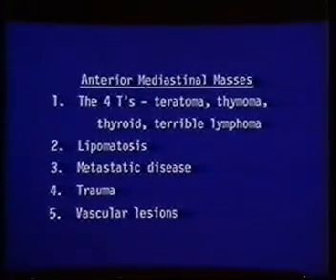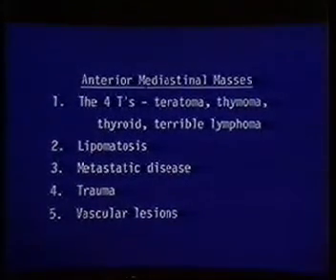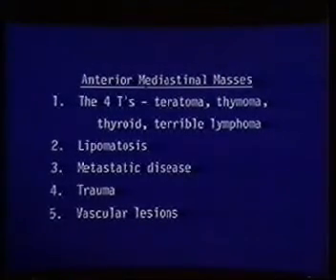Metastatic disease is an important thing to consider in any mediastinal compartment. I'll show some examples in a few minutes, but I think that's something that is not in this classic scheme that really belongs in there. Trauma may affect the anterior mediastinum in particular if trauma is anterior. And then vascular abnormalities. In particular, I think you should realize that as patients age, the aorta goes into all sorts of compartments, and so it can clearly extend anywhere from the anterior mediastinum to the posterior mediastinum. Very useful to keep vascular lesions in mind as a general rule, just because we prefer not to stick large gauge needles into them unsuspectingly.